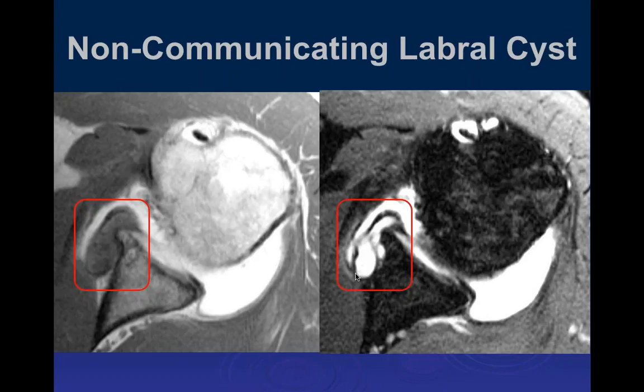It then becomes very inspissated, so it's really kind of a thick gelatinous structure over time as the fluid actually gets resorbed. But there's still enough fluid, still enough water in it to be bright on the PD FATSAT images. But once this becomes thickened and inspissated, the connection to it often becomes blocked off. So when you put contrast in it, you don't necessarily fill these.